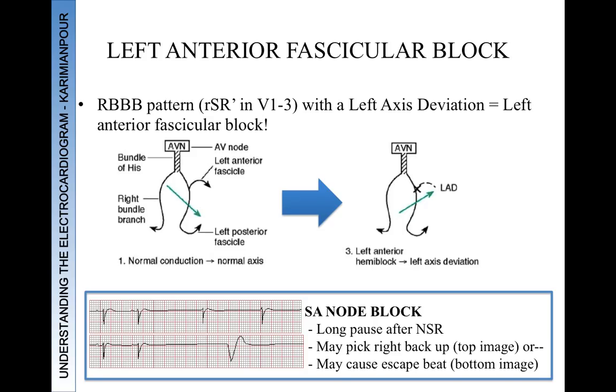This one here, I didn't know where to put it, but an SA node block, essentially a long pause or asystole after a normal sinus beat rhythm. It may pick back up with normal sinus again, or it may cause an escape rhythm or an escape beat, which is shown on the bottom image, which is a PVC here.